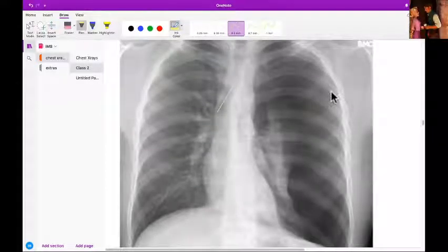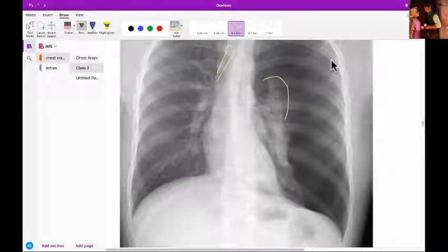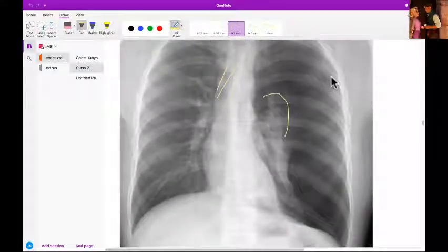Yes, there is shift of the mediastinum, correct. There is collapse of the lung. But what is causing all of these? The diaphragm. Yes, pneumothorax, pneumothorax. Okay, you guys got it finally. Okay, so this is pneumothorax. Where did you say pneumothorax? I didn't see it anywhere.